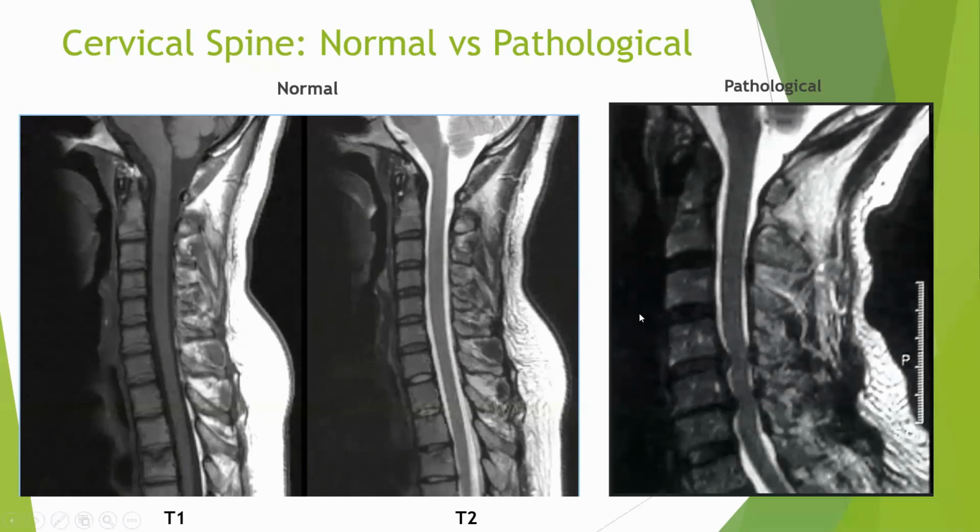There are many other things, osteophytic lippings, as you can see, but those are best noticed essentially in your X-rays. But one thing I would like you to see, it is actually evident only under T2 spine in the intervertebral disc. So please write it down or note it down here. Between the intervertebral discs, we all know that there is nucleus pulposus within annulus fibrosus. Within annulus fibrosus rings, in the center you have gelatinous or gel-like material called nucleus pulposus. And since it's gel-like material, obviously there will be water.